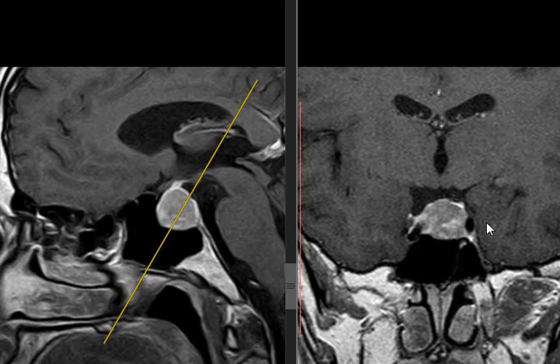Could it be metastasis? Yes, it could. Every mass can be a metastasis. Unlikely, very rarely, but it could. Could it be something else bad? Hamartoma? Thickening in the stalk could be hamartoma? A hamartoma is not enhancing. This is enhancing. Okay. What else could it be? What's left?